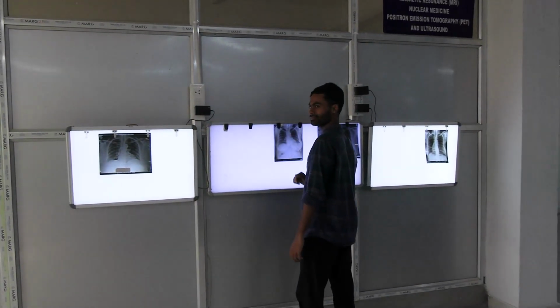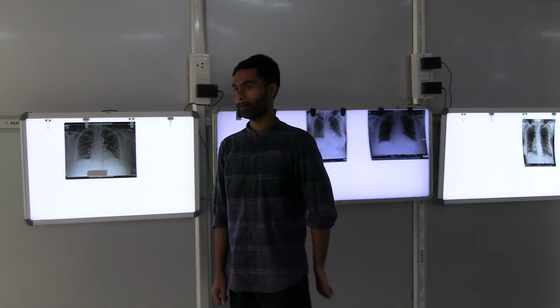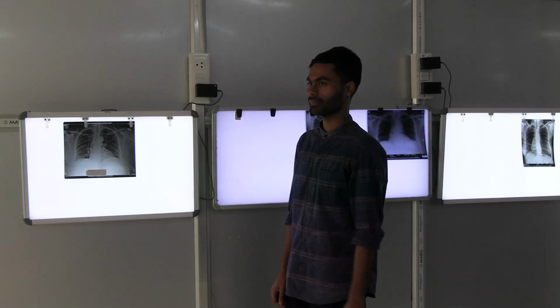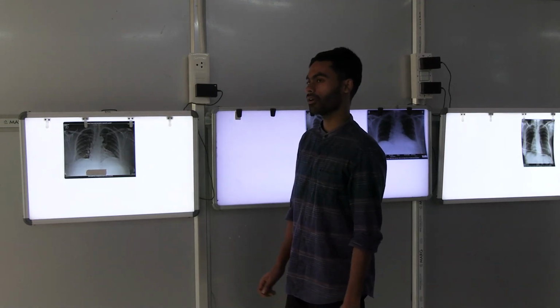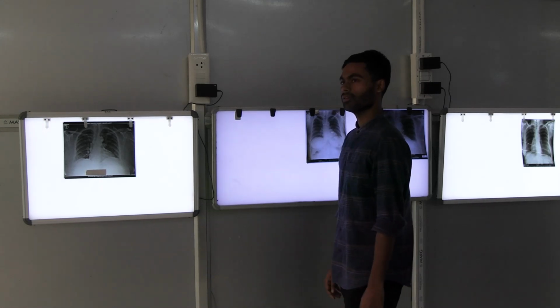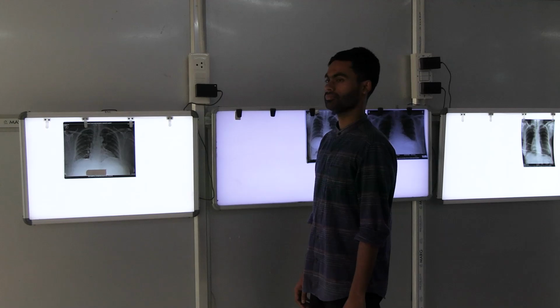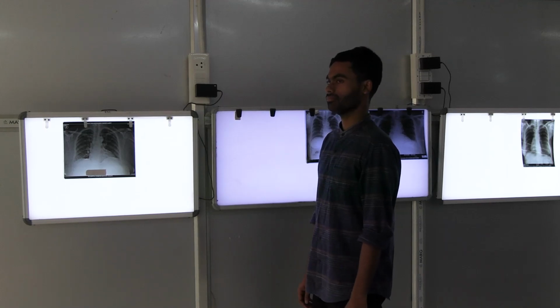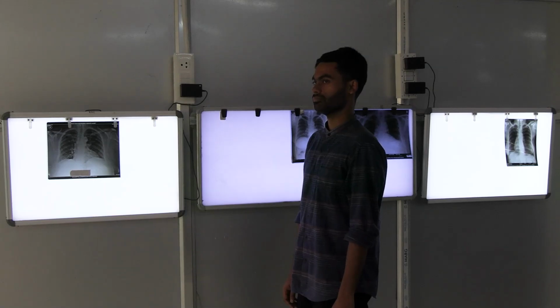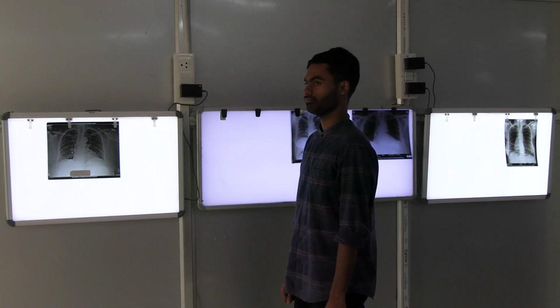Aortic knuckle. How is this aortic knuckle formed? Arch of aorta. What are the parts of the aorta? So which part is forming this shadow? Arch part. How about the ascending aorta? Not visible. Descending aorta? Not visible, it will be falling back, so we cannot see that. Only the arch of the aorta, which arches front to back, is visible there. It is a curved structure that looks like a knuckle, a hunchback. That's why we call it the aortic knuckle. Right?